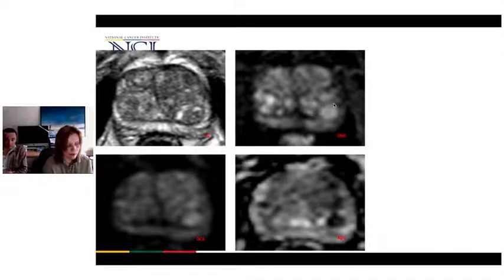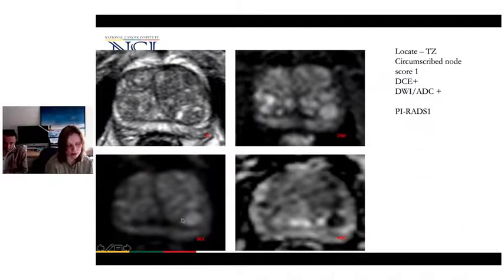How about these images? We see benign prostatic hyperplasia, and we can spot a very dark spot on the ADC image. If you look at the diffusion image, of course, it's a little bit bright, but on T2, we see an absolutely normal encapsulated benign prostatic node, just slightly prolonging into the peripheral zone. It enhances, but normally it can enhance.